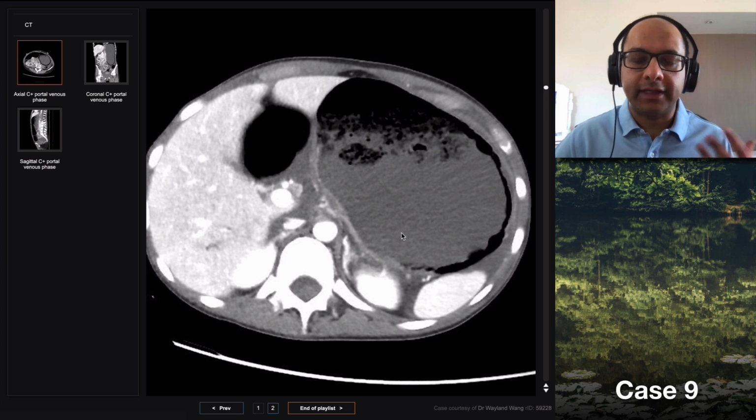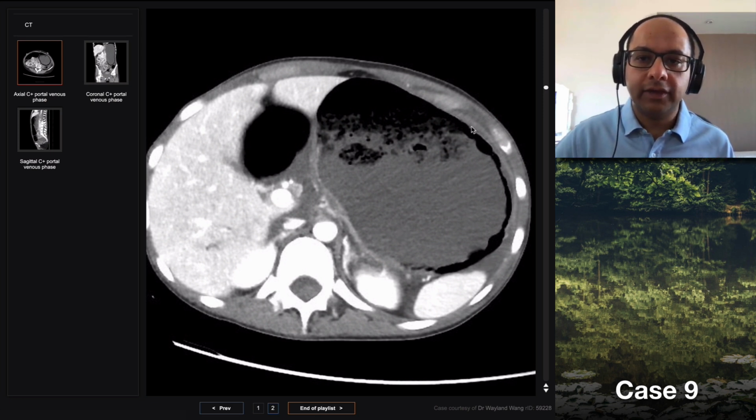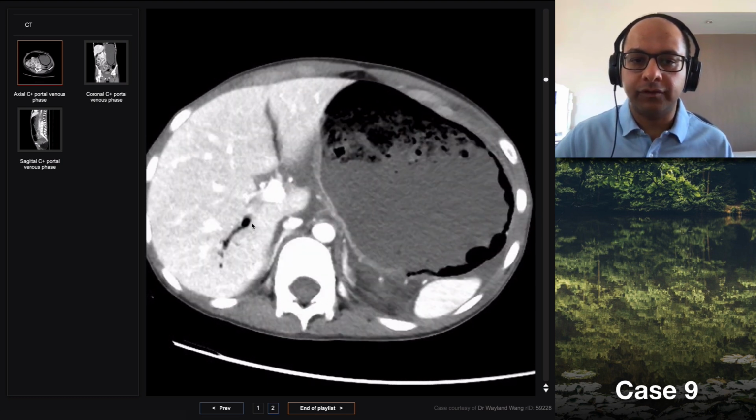And as a result of that stretching and poor flow into the stomach wall, you can get ischemia, necrosis of the mucosa, gas translocation into the wall of the stomach, and then that very easily escapes into the portal venous system and into the liver, as you see here. But this is relatively uncommon because the stomach is more resilient than the small bowel and the large bowel to episodes of ischemia, so we don't see this as much as we see small bowel or large bowel ischemia.